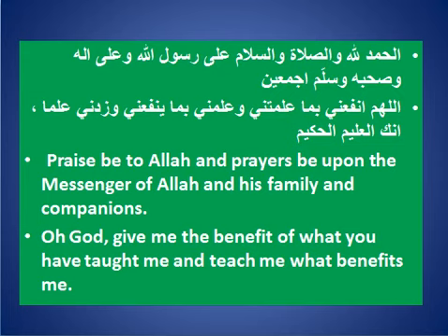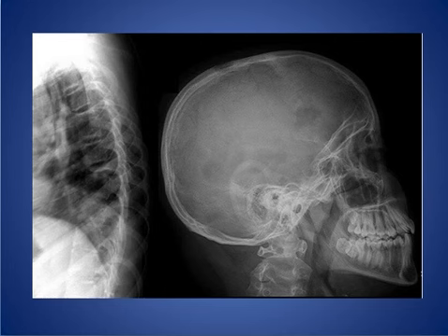My topic today is about presenting some cases in pediatric age group with spot diagnosis. Here, this is the first case, a child 13 years old with back pain, and we have a lateral dorsal spine X-ray and a lateral skull X-ray.